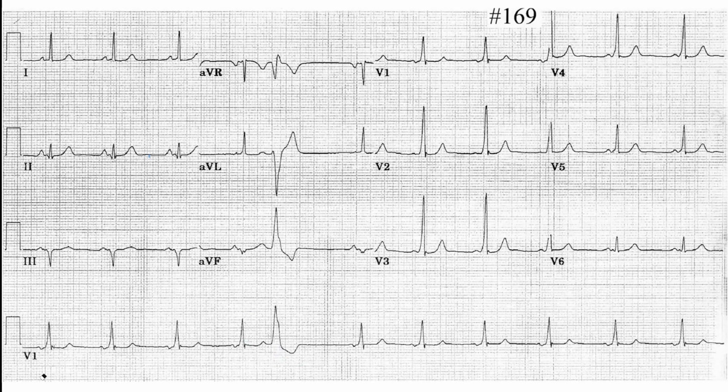Let's see another area, or I continue with the normal part. Yes, continue with the normal part. Do we have P waves? Yes. Heart rate is around... maybe two, I can judge it. 1, 2, 3, 4, 4.5. Normal. 65, good.